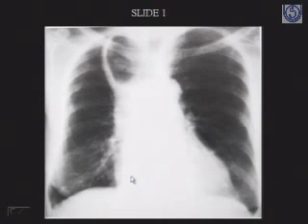There is indirect evidence to say that whenever you have a right atrial pathology, normally the right heart margin occupies not more than 2 to 2.5 intercostal spaces. Some literature says 3 intercostal spaces, some say 2.5. But if the right heart border occupies more than 3 intercostal spaces, always keep in mind a pathology of the right atrium or right ventricle, a cardiac pathology. But it is not a hard and fast rule, it is just an assumption. It may not be there.